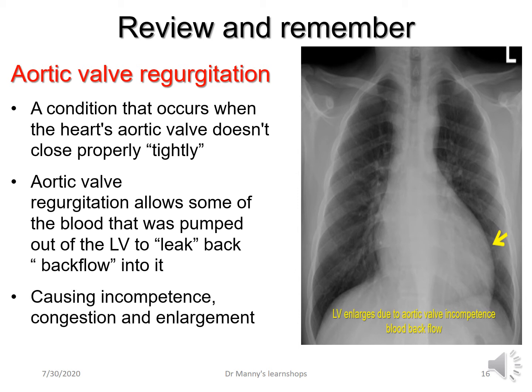This is incompetence. This causes congestion. This causes enlargement. On physical assessment, you may already hear abnormal heart sounds as a consequence of this, an aortic click, snap. But essentially on chest X-ray, the left ventricle enlarges due to the aortic valve being incompetent as a result of backflow.